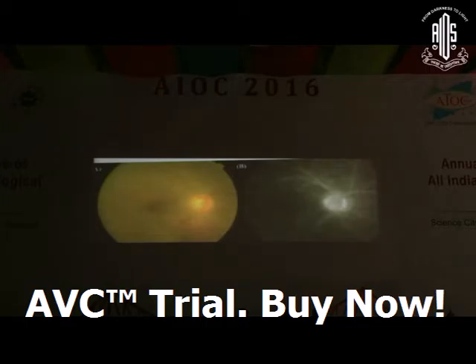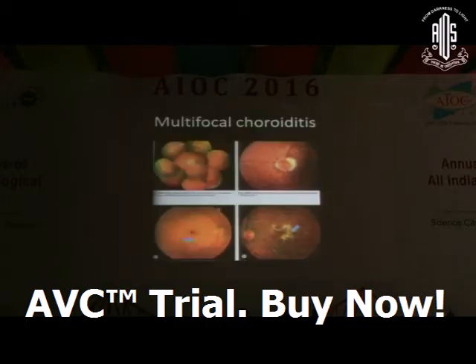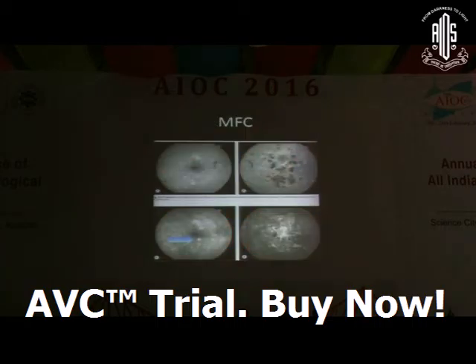It's become more common in the era of HIV. Multifocal choroiditis: the right eye is less involved, the left eye has bridging fibrosis, multiple lesions, and there is a napkin ring around the optic nerve in the upper right-hand picture. On angiography, there are hyperfluorescent lesions. The new lesions are hyperfluorescent, and the old lesions are staining like a scar.